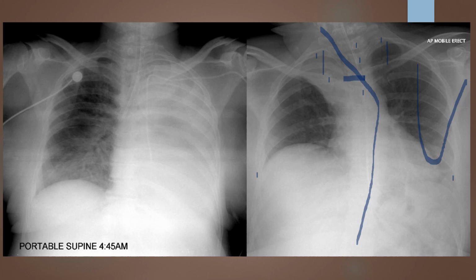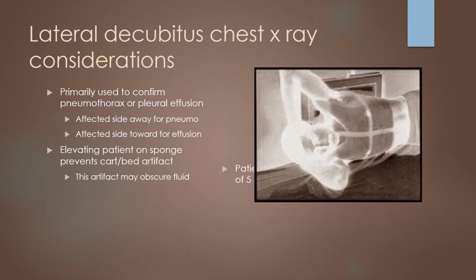And then thirdly, we have a very limited number of ribs visualized. So we have 1, 2, 3, 4, 5, 6, not even a complete 7 ribs visualized in the posterior lung field. So we would need a much better inspiration on our repeat. Okay, hopefully that gets you ready to go on your AP portable projections.